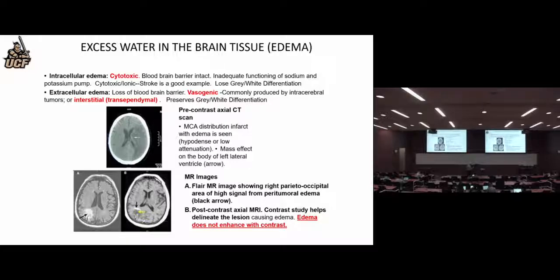Usually there is not much in the way of gray matter left on the sides. There's a little bit here, but you tend to lose the differentiation you see ordinarily between the gray matter and the white matter, which is actually sometimes not that well seen on a CT scan anyway. But this is the most common type of edema seen in a stroke, cytotoxic edema. Though you can get, especially chronically after the stroke, development of some vasogenic edema too.